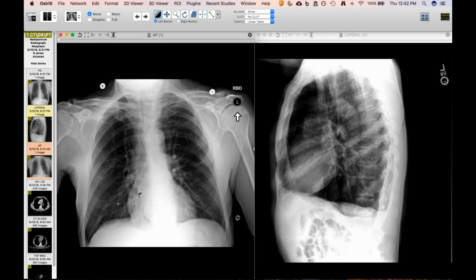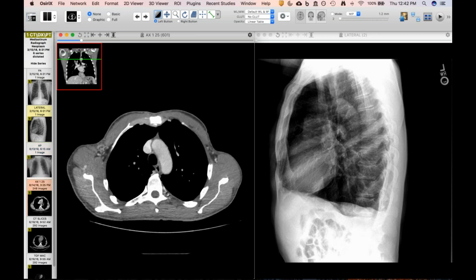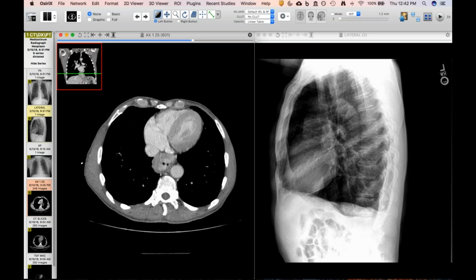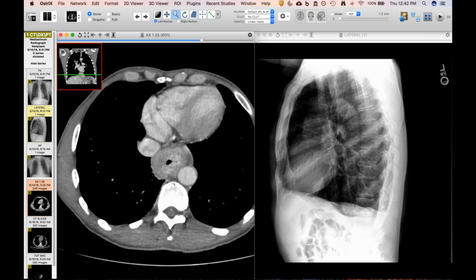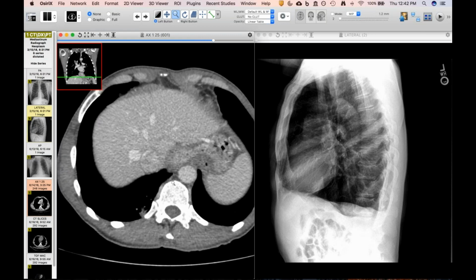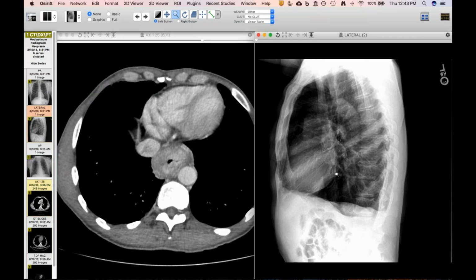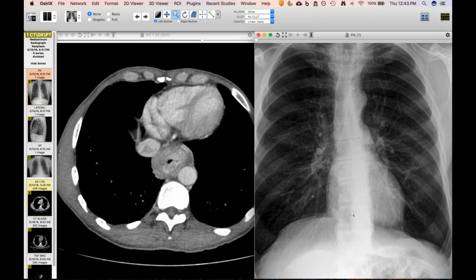It turns out he had some chest pain and maybe some dysphagia, so difficulty swallowing. And so we told him to get a CT based on that finding. I was wondering if there could be either hiatal hernia or mass, but it turns out this is what his distal esophagus looks like, and this was done the next day. And so he did in fact have a mass there, and this turned out to be an adenocarcinoma of his distal esophagus.